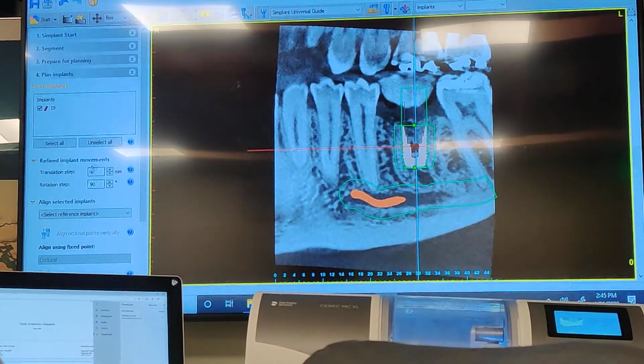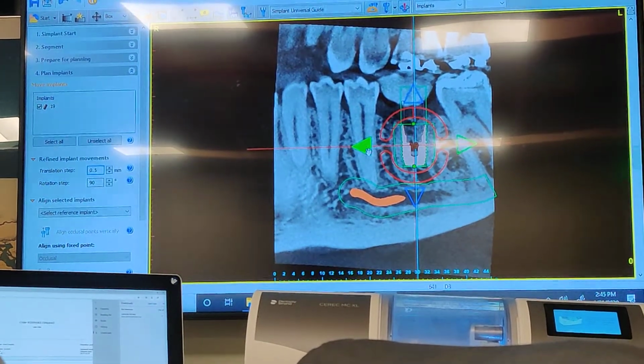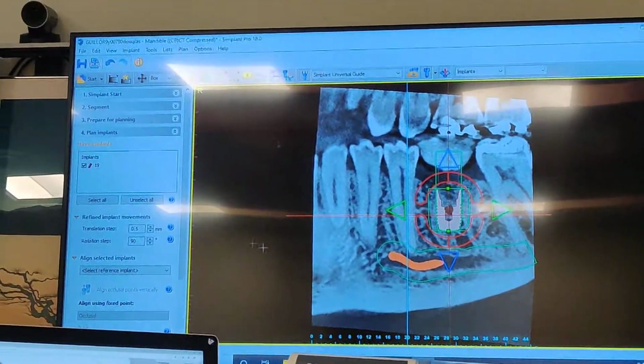Everybody get it? That's maybe a little bit much. Let's do 0.5. Okay. What do y'all think? Cool, huh? So, do you like my position?